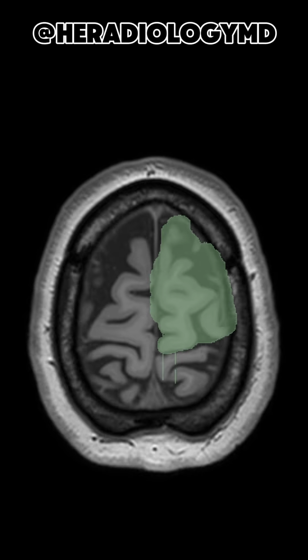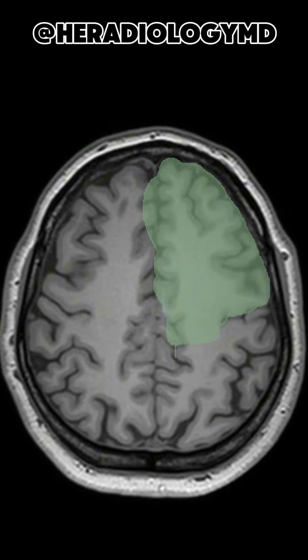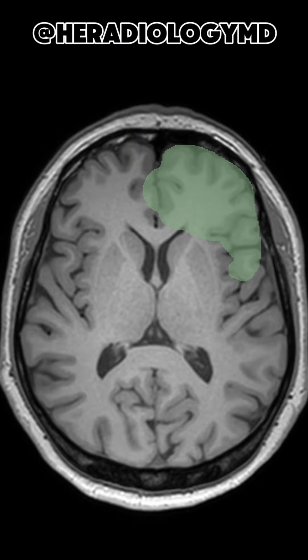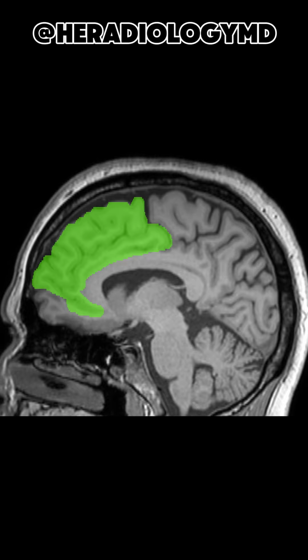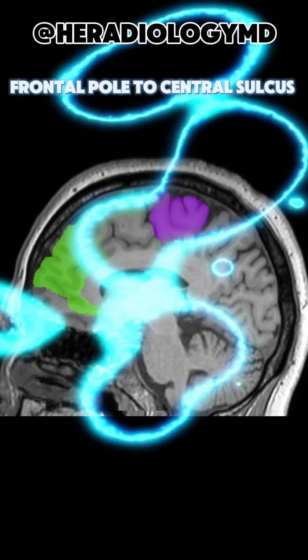Let's start with the basics. On an axial image, the frontal lobe is located anterior to the central sulcus. Everything in front of this sulcus belongs to the frontal lobe. The sagittal plane gives us the best overall perspective. Here, the frontal lobe extends from the frontal pole back to the central sulcus.